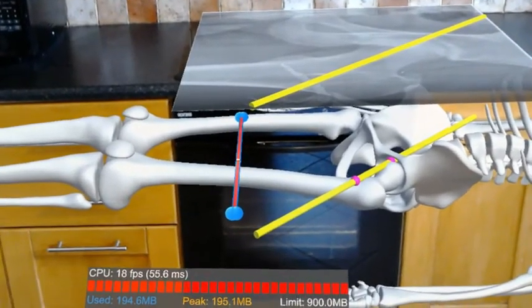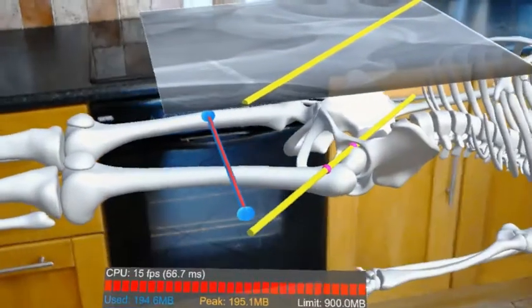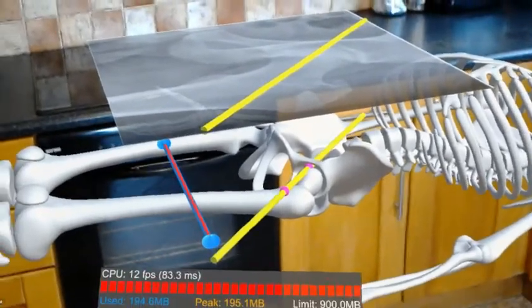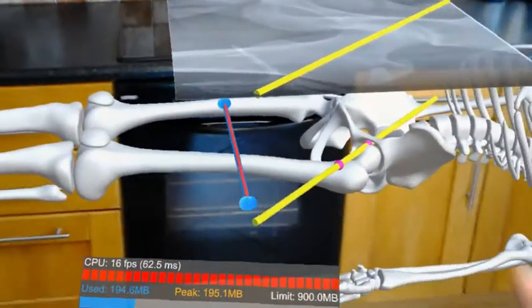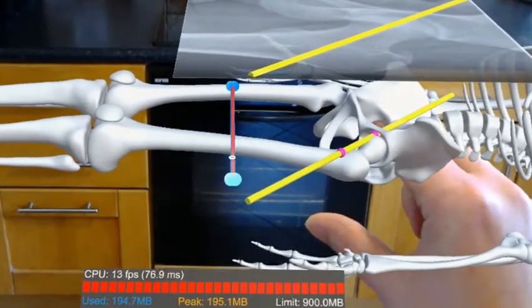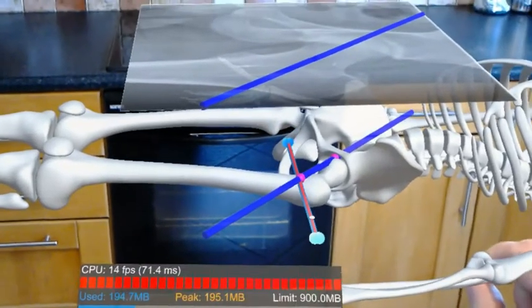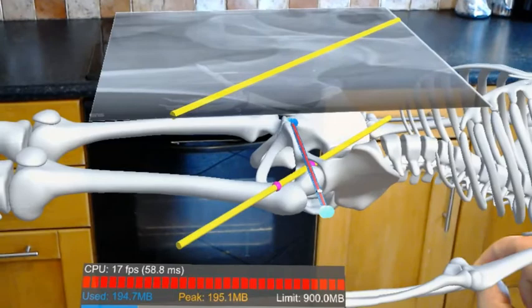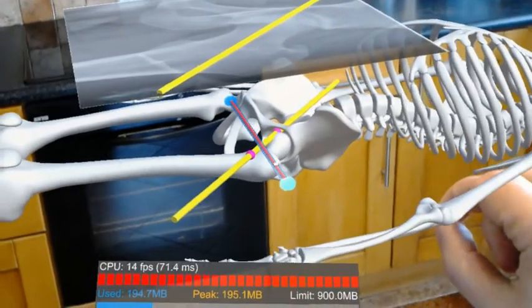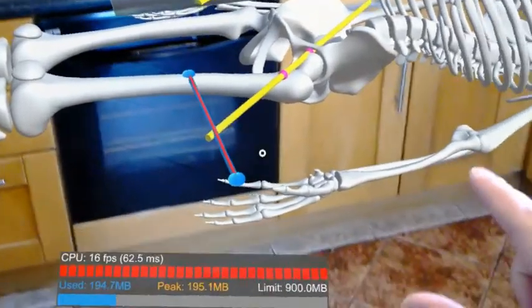This red line is an AR representation of the jig, and the jig is what is used to essentially line up the screw and put it into the patient's hip. So, as you can see, I can pick this guy up, move it around. If I make contact with one of these points, it should turn blue. Same with this one. And when it lines up correctly, making contact with both of them at the same time, it should turn green, which I will attempt now.